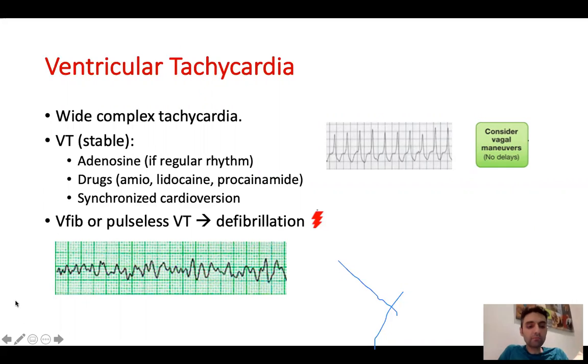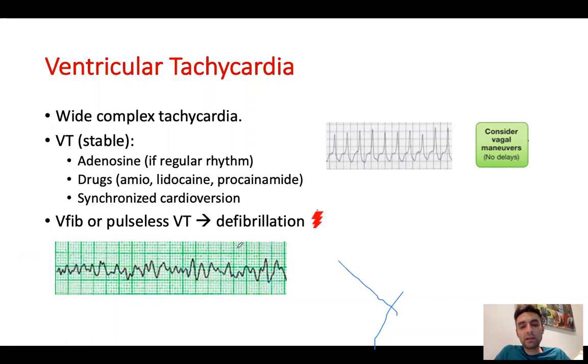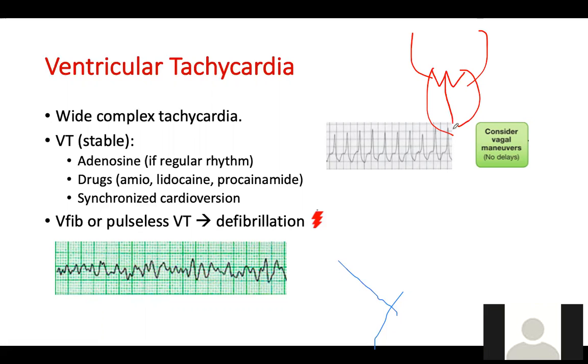Yeah. So when you have an irregular wide complex tachycardia, one of your differentials, especially in pediatrics, is pre-excited atrial fibrillation, or someone in AFib with WPW. You heard of this before. We mentioned it before, if you remember. Yes. Okay. So if you have a patient, this is his beautiful heart. The abnormal pathway works more. You have a patient here.